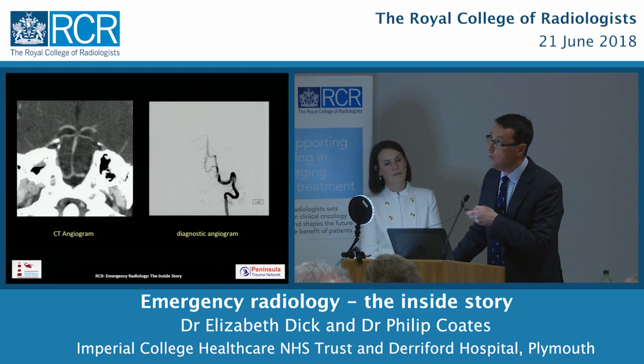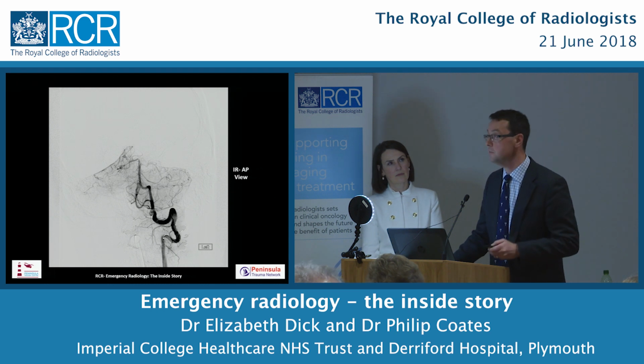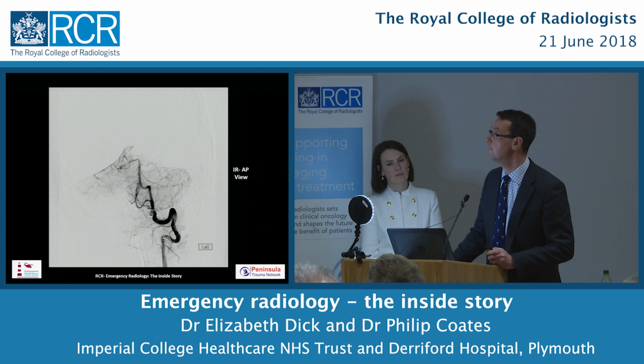So that's where the clot was in the basilar artery previously. There's a lack of filling of the vessels here that we'd expect to see filling. If I mag up that a bit, there's evidence for filling defects in this area around here in the basilar artery, and again a lack of filling of the vessels here, which fits with his clinical situation.